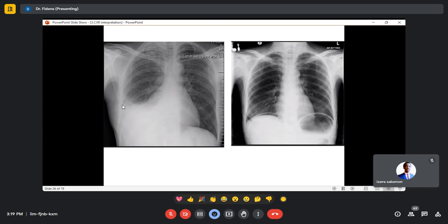Yes, Olivier, don't cheat us. I know you don't see it very well, but I can see there is rotation to the right side, because the medial end of the clavicle is here, the spinous processes are here, and on the left side is here. Is this distance the same as that one? There is slight rotation to the right side. That's one.